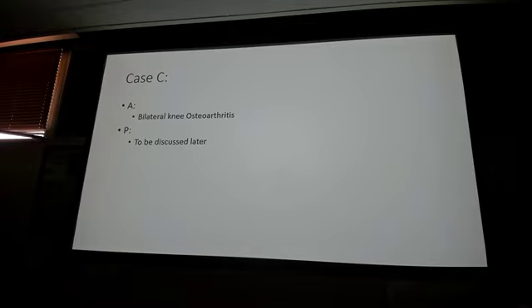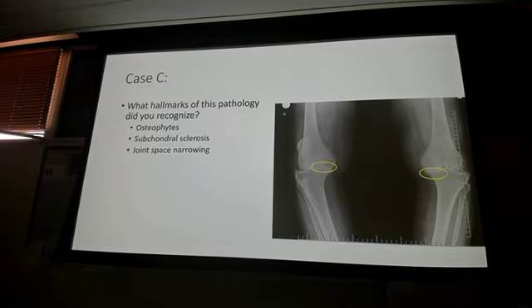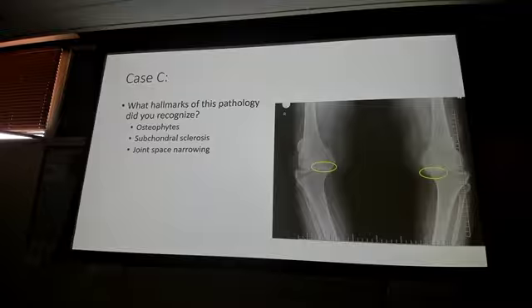Yes, sir. At what point would you consider that significant joint to be subluxed? So this would be partially subluxed, yes. Right? So look at right here, I'm leaning over, I don't have my alignment right here, I don't have my alignment right here. So for those that would want to call this some mild subluxation, absolutely appropriate. With really bad arthritis, particularly in the knees, subluxation is common, especially once they get to this bone-on-bone area.